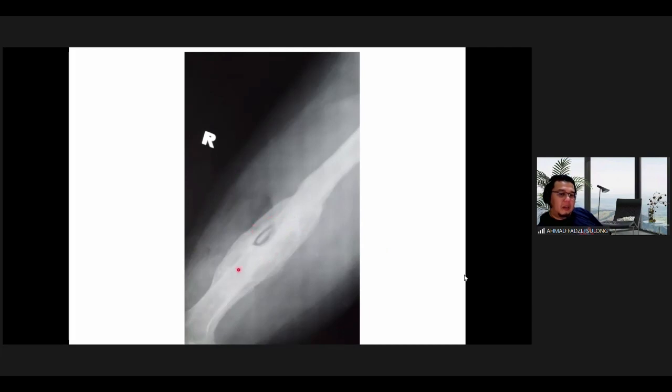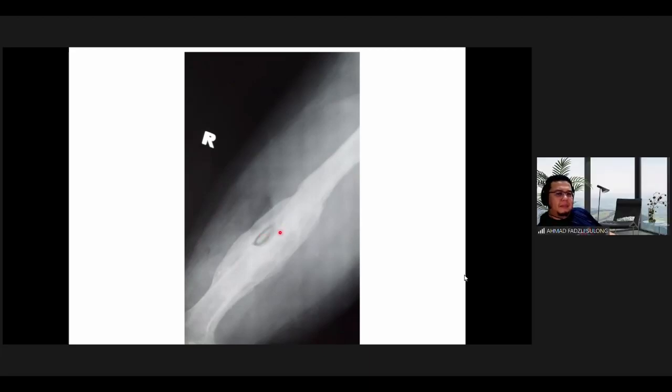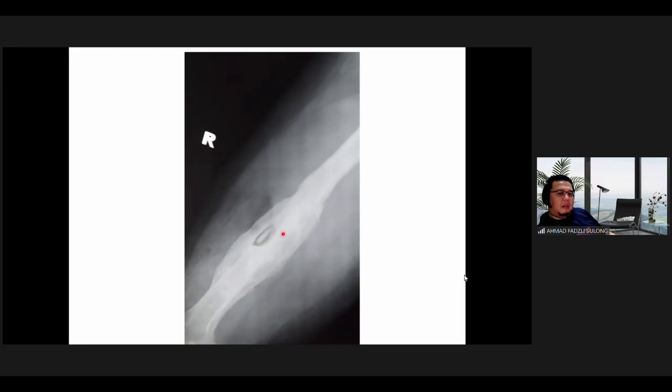This one? The inside one? Okay, so this is a sequestrum. What was it, a sequestrum? The dead bone. Dead bone, alright. Where's the involucrum? The one surrounding it. The encasement. This one? Or the black one? The border after the black. This white one? So what's involucrum?